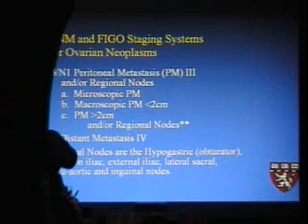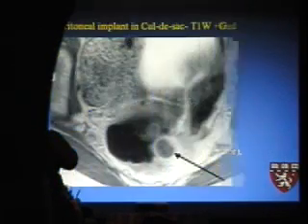These patients will be treated with chemotherapy before their radical hysterectomy and oophorectomies in an effort to cytoreduce the disease. And so that's an important piece of information to put in your reports. Don't just say, multiple peritoneal mets. Let's measure them and let's put in some detail in the report. And then obviously as it spreads onwards, interstitial disease and nodal disease.